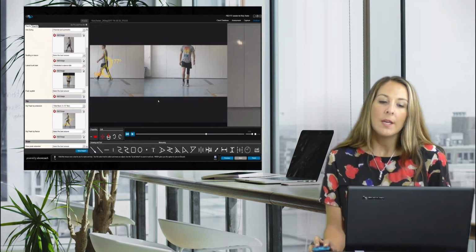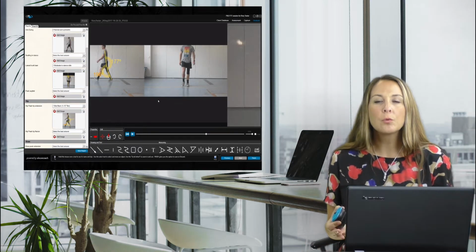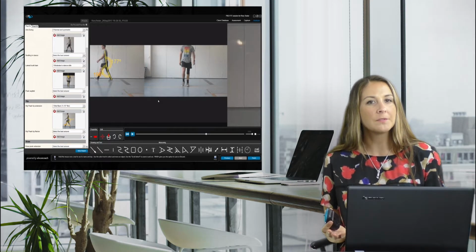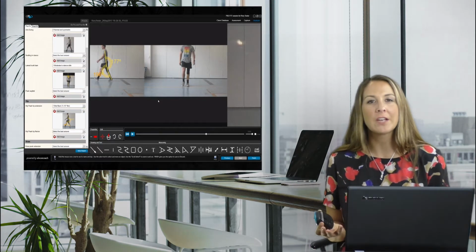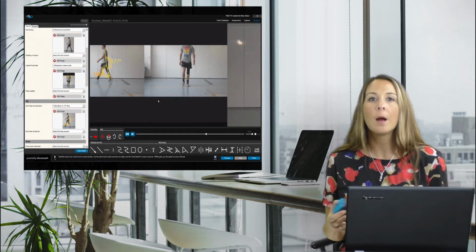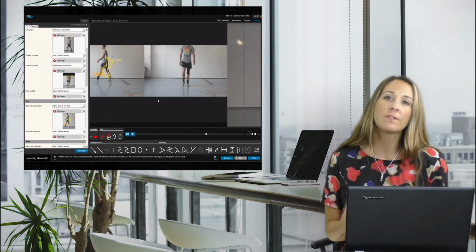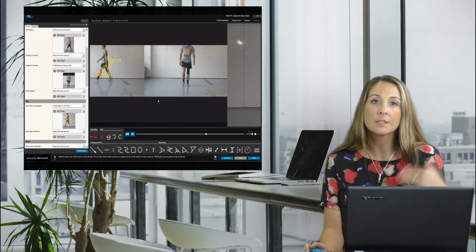Okay, so those are some helpful tools if anyone's used the web-based software and you've gotten the large angle a couple of times. It can be a little frustrating because you have to actually stop and start over again. Whereas this, if you don't like the number that you're getting, you just hit shift and it will get the smaller angle for you.